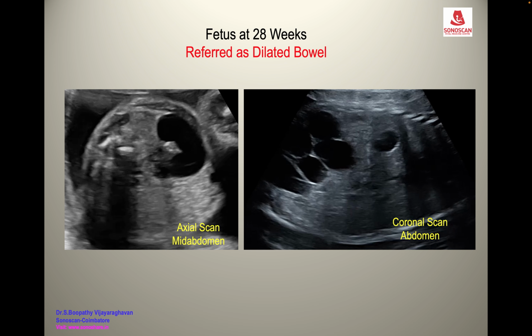Hi everyone, we will see the next in the series of image to diagnosis in fetal medicine. Now these are images of a fetus at 28 weeks, which was referred for second opinion as dilated bowel.